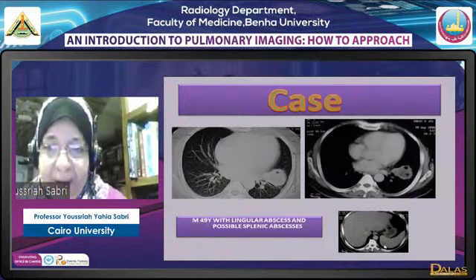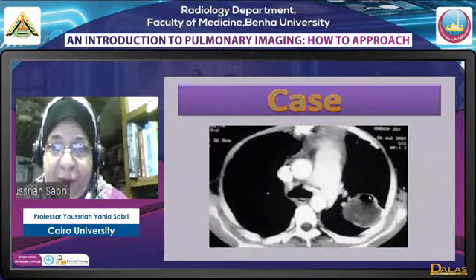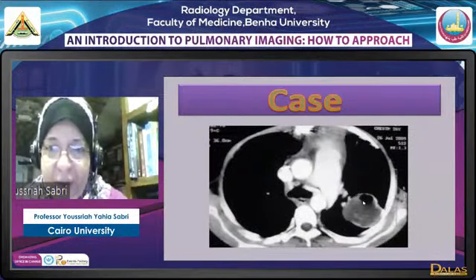There is also another abscess in the spleen here. Another case of an abscess, central lumen with fluid and air fluid level and a uniform wall.